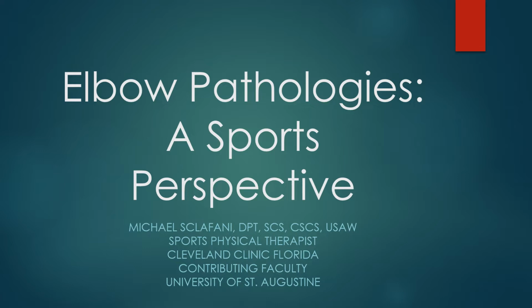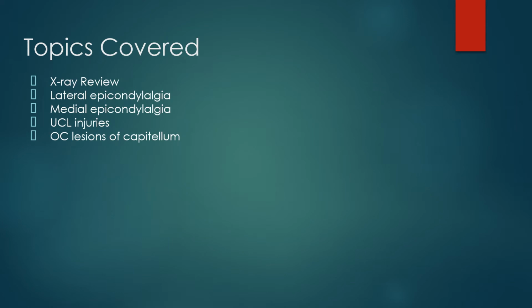And I'm going to be talking to you guys today a little bit about some elbow imaging and how it applies to a sports population. So some of the things that we're going to be talking about today include a review of some of the x-rays, as well as a couple different pathologies that you're likely to see in your outpatient sports medicine population.